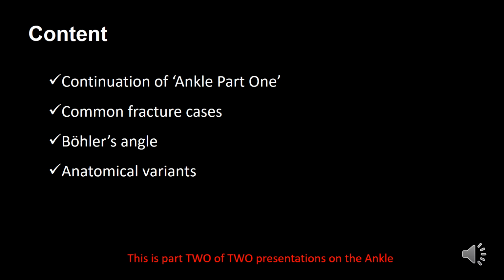Welcome to part 2 of the ankle. If you haven't already reviewed ankle part 1, we recommend that you do in preparation for part 2. So in part 2, we will continue to present you with a series of fracture cases to help develop your learning. We will also consider Bohler's angle, and finally we will look at some anatomical variants.